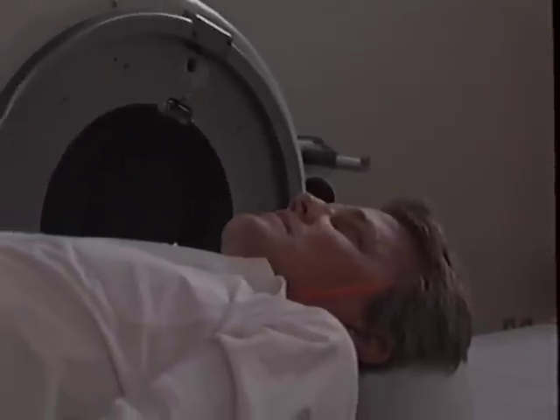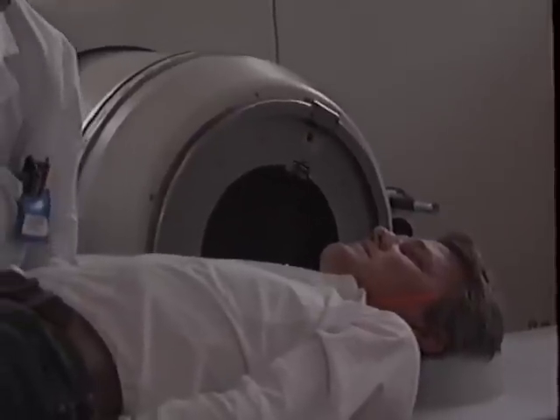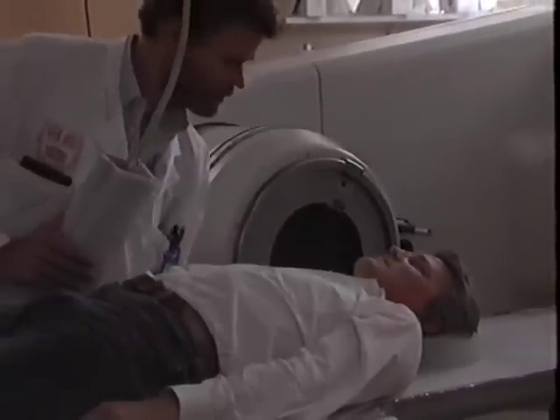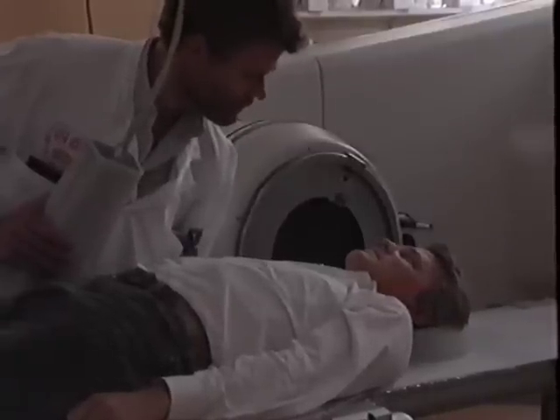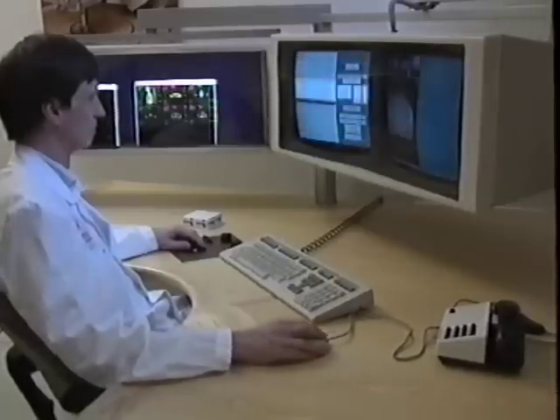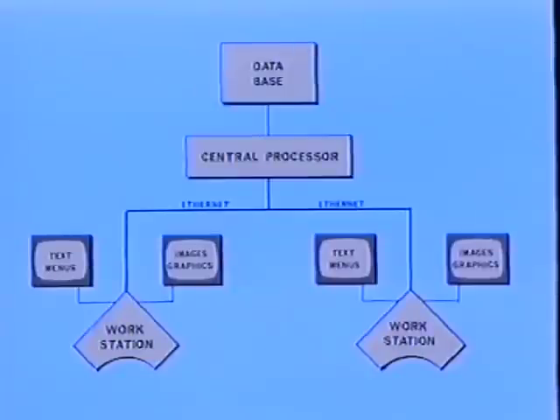Management System, TMS, from HELAX is the new generation in computerized planning of radiation oncology. The system is designed to meet tomorrow's need for three-dimensional planning of cancer treatment, from the stage of tumor and target definitions to follow-up of given treatment. The TMS workstations are ergonomically designed for extremely high man-machine performance.